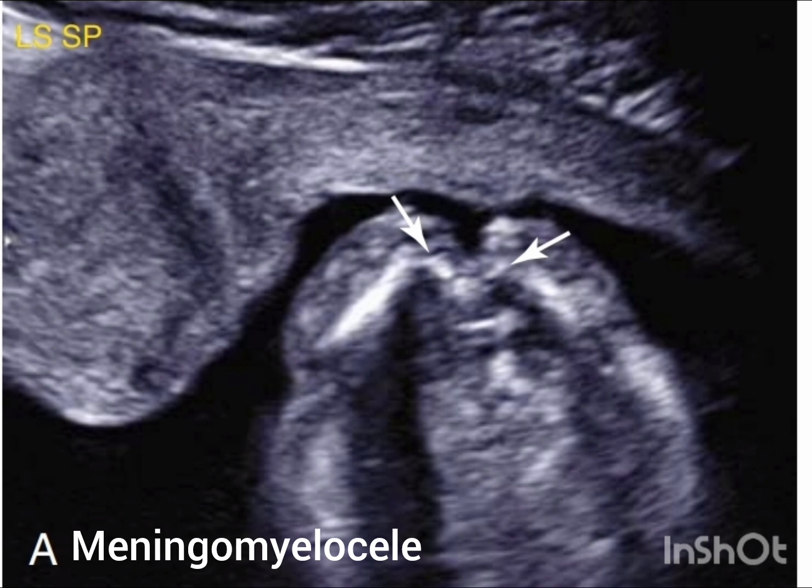The sonographic features of a spine defect include visualization of the meningocele sac, such as a cystic or complex mass extending off the posterior aspect of the spine, a full thickness defect in the overlying soft tissue, and an associated vertebral defect with splaying of the posterior elements.